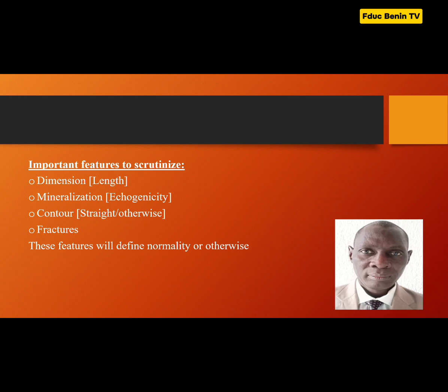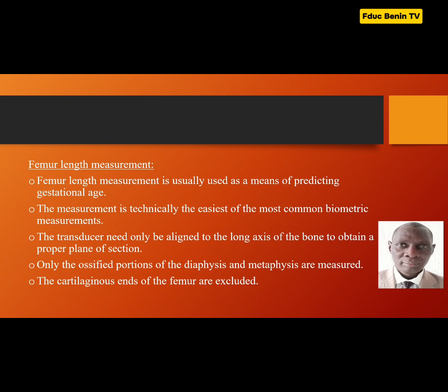The third is the contour, whether that bone is straight, which is the case, that is normal, or otherwise. And then you look closely at the bone for evidence of fractures. And these features will define normality or otherwise in the bone in question.